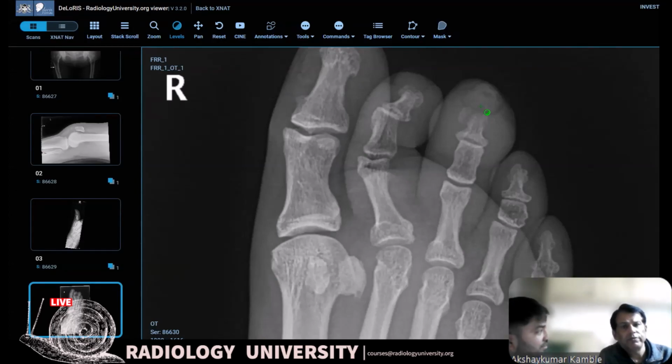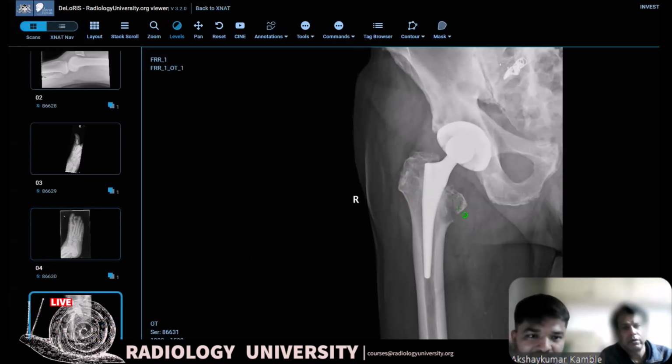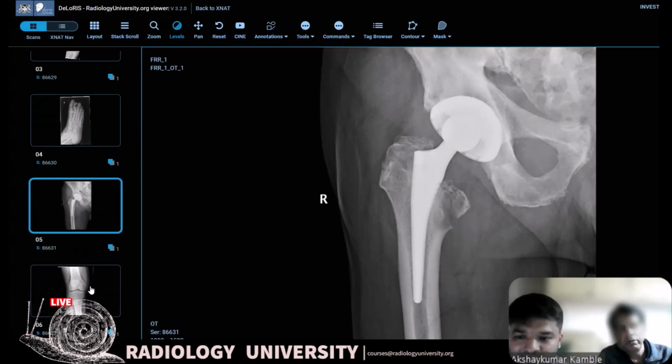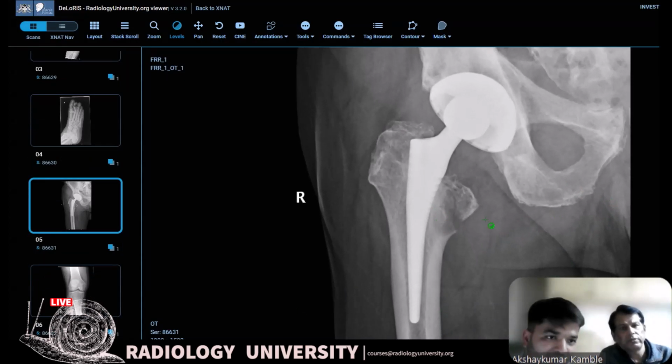Oh, so just the normal fracture will not get the mark. Okay. So this one again, fracture. I think this is also pathological fracture, isn't it? Yeah. Most likely metastatic deposit for viva cases.